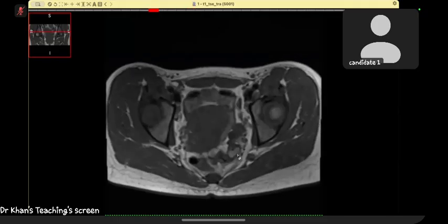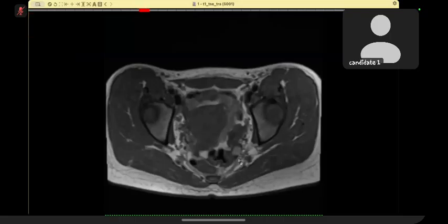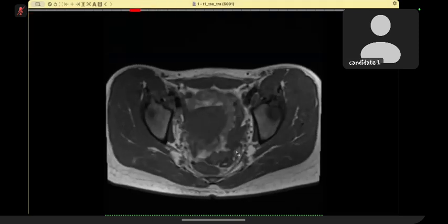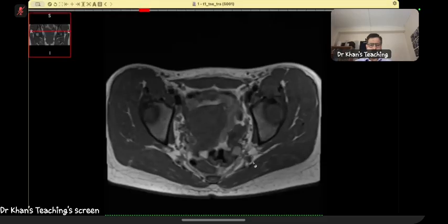So, summarizing my findings, left ovary has a cyst which has a T1 hyperintensity and a blood fluid level on T2 weighted sequence, which is classical of endometriotic cyst. And I'll be conveying my findings to the referring physician and would refer this patient to the gynecology MDT for further management. So what is the optimal sequence to diagnose hemorrhage?